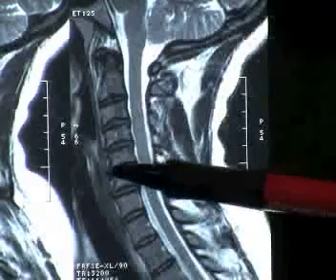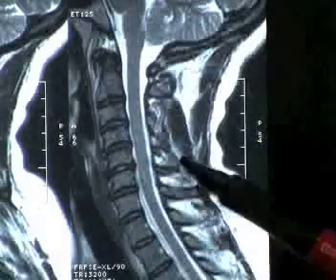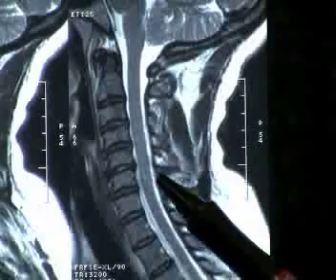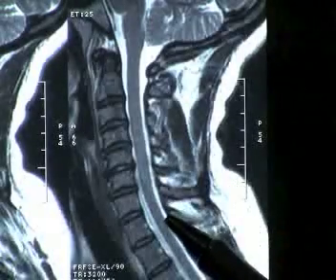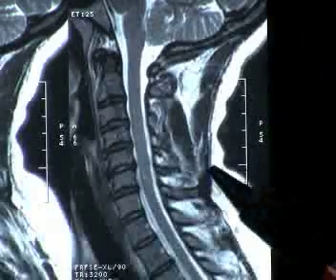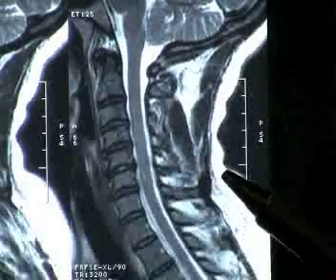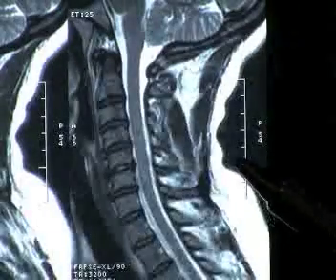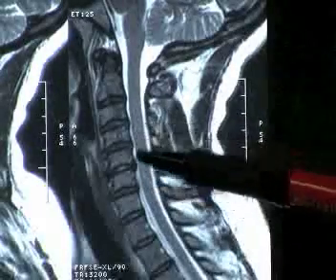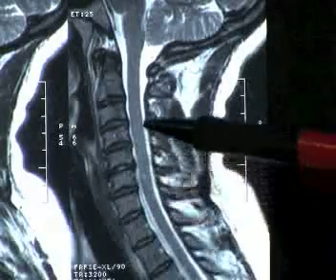These are degenerative changes. Sometimes doctors refer to these as arthritis. In that sense, we mean arthritis in the sense that it's osteoarthritis, meaning wear and tear or degenerative changes. I prefer to use the term degenerative changes because people seem to know intuitively that degenerative changes are to be expected to some extent. In fact, these are what I would term age-appropriate degenerative changes for somebody in their 50s. Nothing very severe looking here.